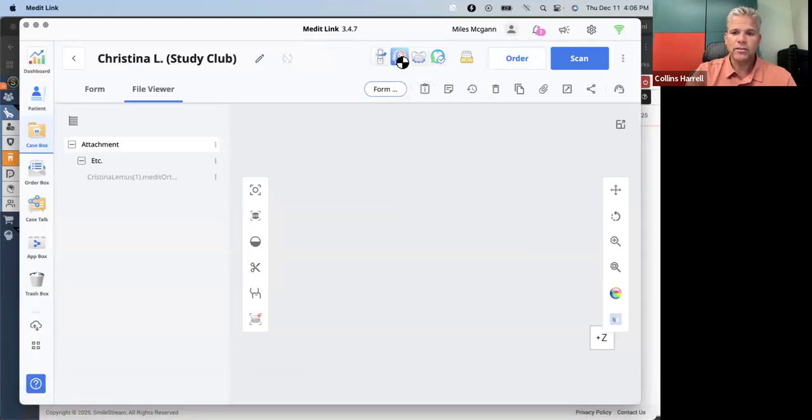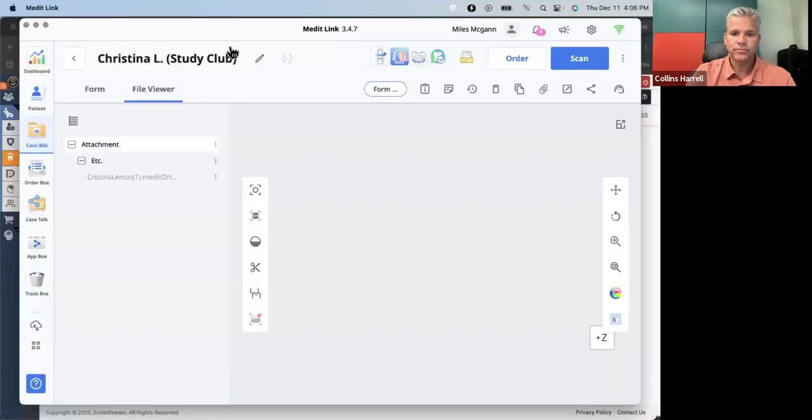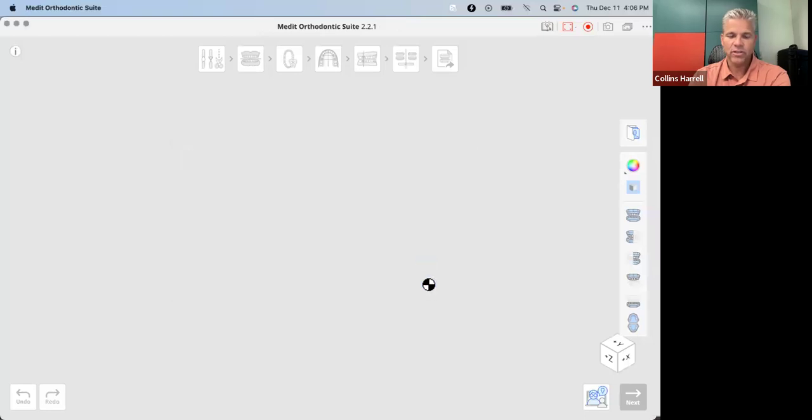And then we'll go ahead and open. We already had it open. Let me close it so we can start from the beginning. So then I open Medit Ortho Suite. I know you guys know this, but just for whoever else might be watching now or later. Hi, Dr. Yang. Thanks for sending a couple cases. We'll get to yours next. Hi, Dr. Lorenz. So when we open it, any files we have attached become projects we can work on, or we can hit cancel and start new if we have the STL files. So we're going to open the one you sent.